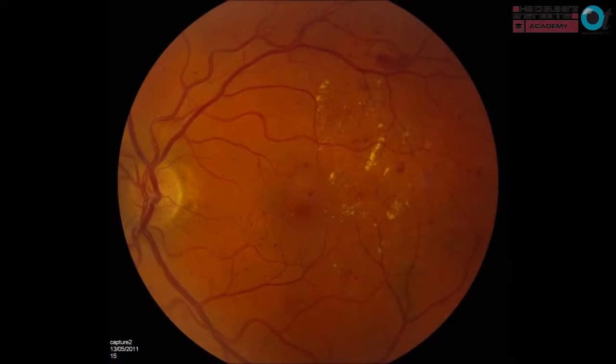So this is a case example of somebody I treated with laser. This is the photograph of their left eye. They've got 6/5 vision, the fovea is dry, but you've got 1 disc area of circinate exudation that's just supratemporal to the fovea with retinal edema.